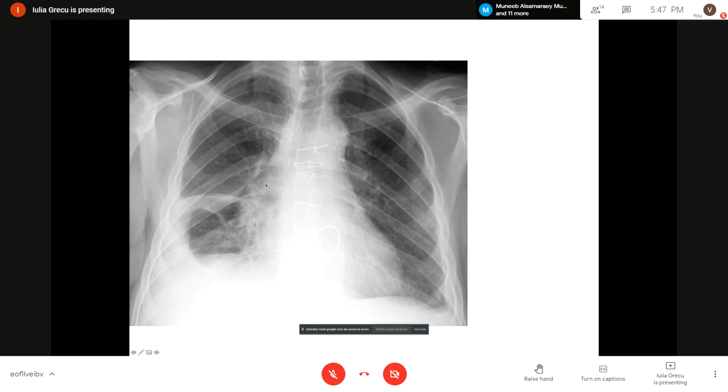Don't go too directly into the diagnosis. You have to start with the baby steps, like there is an increased cardiothoracic index, like your colleague said earlier, because we can do measurement between the both edges of the heart, the right and the left.